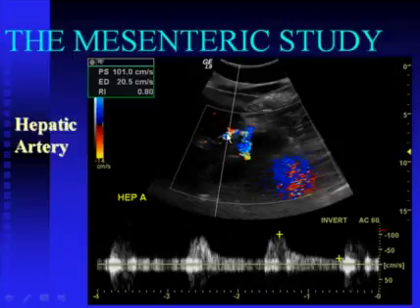Their waveforms in a normal situation, again, should be very similar to the celiac trunk. Good systolic upstroke, good sustained diastolic flow. And I show you this image because you see this is a real world image. There is a great deal of noise because Doppler gain is turned up very high. There may even be some venous interference, but it doesn't matter. You're interested in the arterial flow signal, and your ability to measure peak systolic and end diastolic velocities.